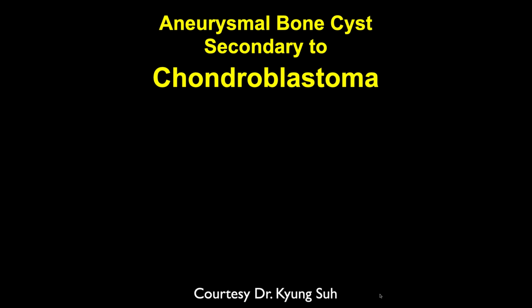And there are many different tumors that can be associated with aneurysmal bone cyst. Aneurysmal bone cyst is probably not a real lesion itself. It's probably a secondary bony reaction to some underlying pathology, of which you don't always make a diagnosis. But this patient had chondroblastoma underlying it in this location.